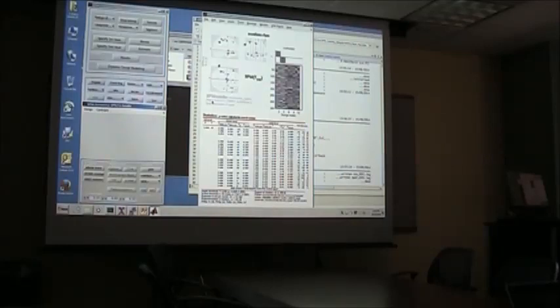I think we should wrap up, it's 2 o'clock. But also in the manual, you can do basically the same thing again on a group level. You start using the images from each subject, put those in a model, and run the same thing again: estimate your model, look at a certain contrast, look at the results.